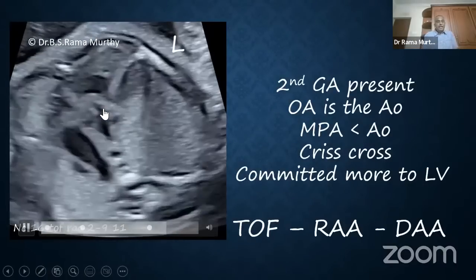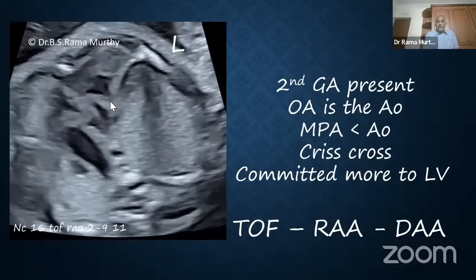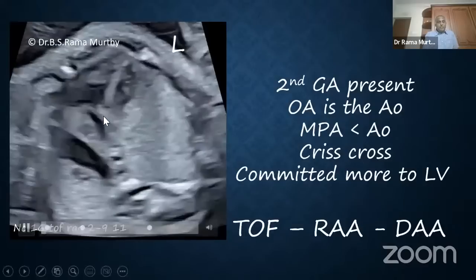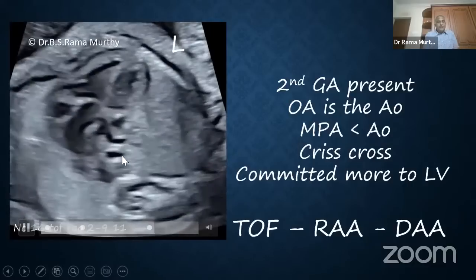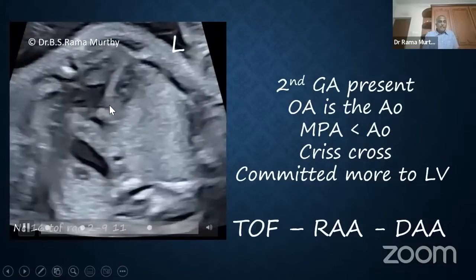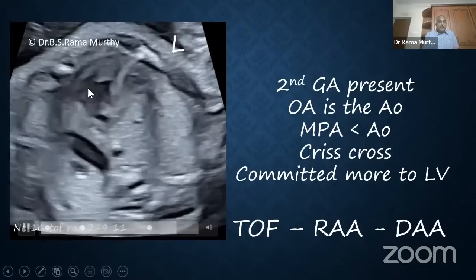The pulmonary artery also, you will realize very, very easily the fact that the pulmonary artery is dividing. So you can see the division there. And lastly, I just want you to look at the relationship of the ascending aorta and the pulmonary artery.